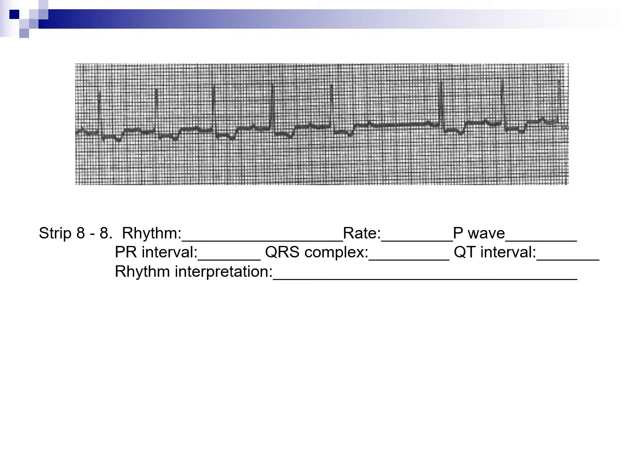The P waves that we have, they are sinus. So we have P's coming along, and they are on time. If you were to measure them out, you have one P that's extra, so therefore that puts us in a higher grade block. The PR interval varies between 0.28 to 0.32. So when you're doing your measurements, you can see that your PR is not the same. It is not constant. It varies.